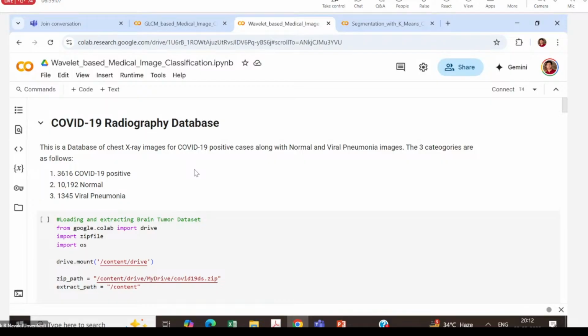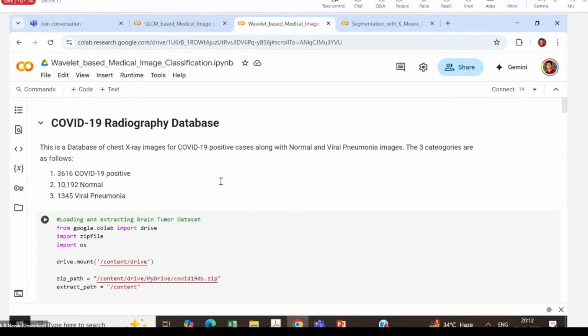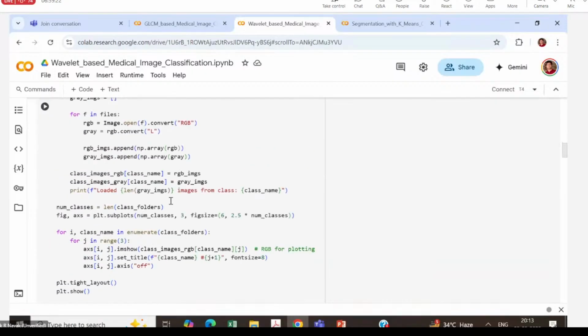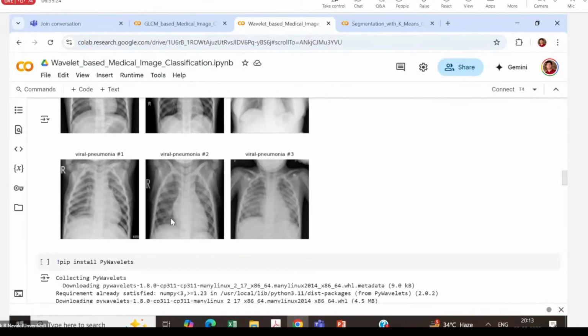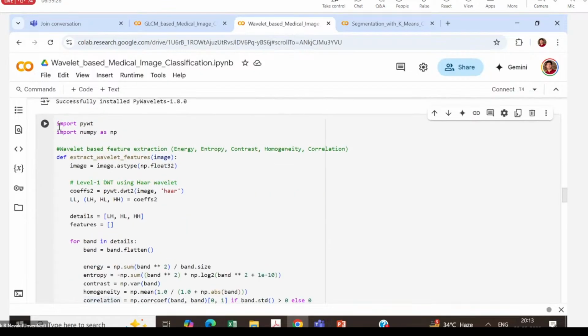That wavelet can be different; you can choose any mother wavelet because you can use any different functions. So we've chosen the Haar wavelet, which is a kind of wavelet that is very simple, right? If you look here, we have made changes only in the feature extraction function. The rest of the functions are exactly the same. Only this function is different. It was previously GLCM and now it is wavelet-based feature extraction.